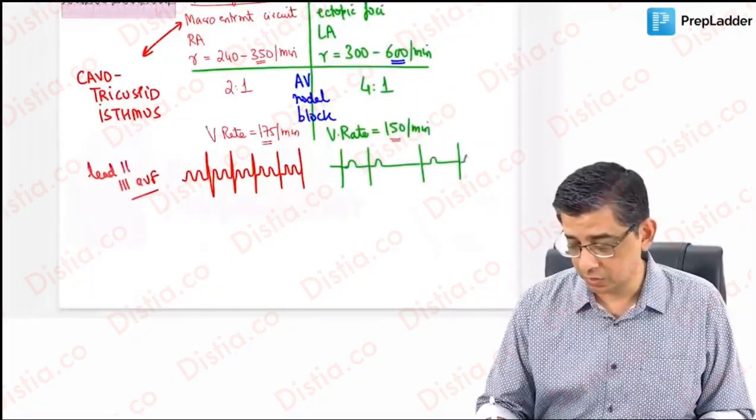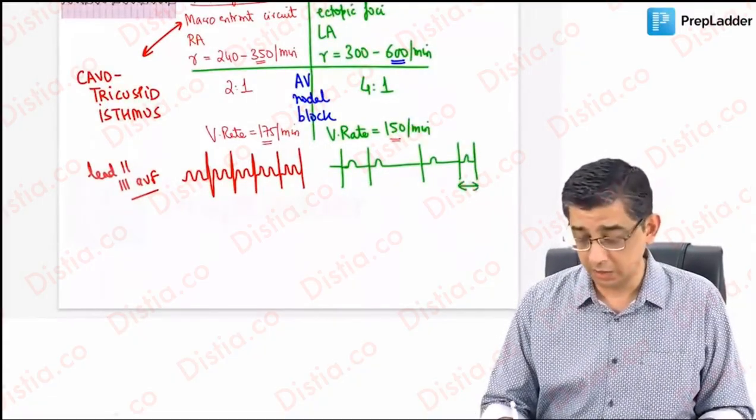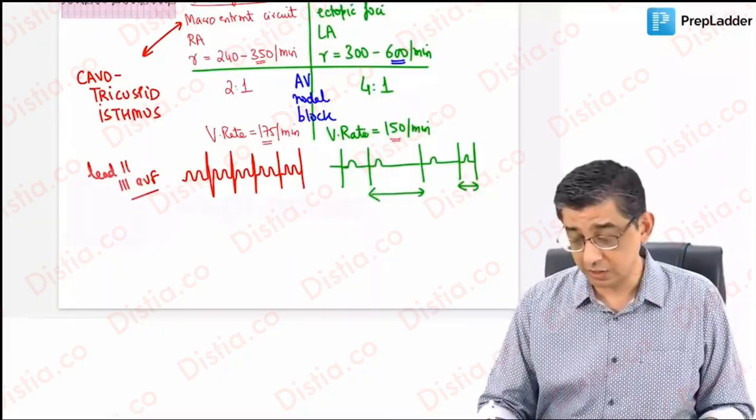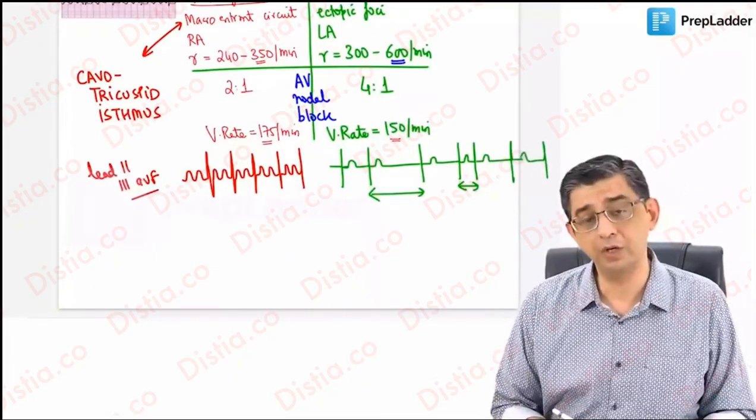You can notice the huge difference. The heart rate has suddenly jumped up fast, then has become normal. I did not say slower. I said it has become normal. So this kind of arrhythmia where heart rate can touch normal is present only with respect to atrial fibrillation.